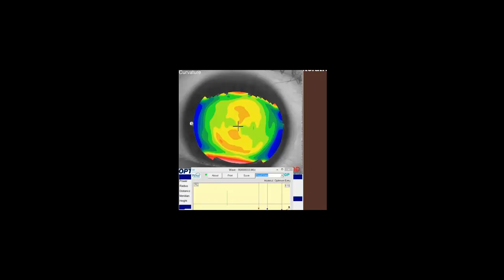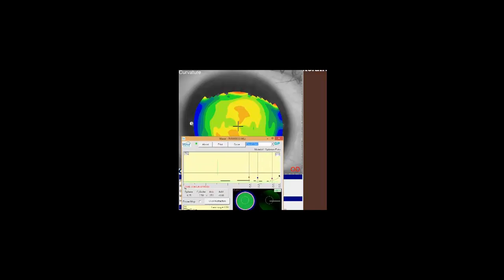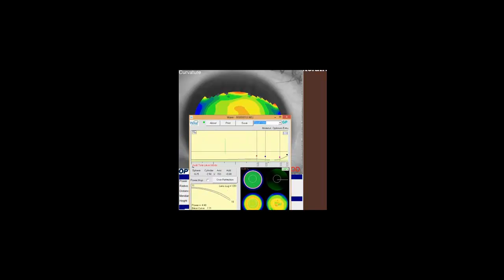I see from your clinical request you're looking for assistance in trying to get your lenses to fit a little bit better. Well, if you look at the designs, first thing to notice with this patient, you have a couple diopters of corneal cylinder. So as you know, your two principal meridians are right about here and this way. So I noticed that you went with the G-SIM design, and based on the patient's previous contact lens history, it looks like you tried to match that lens pretty closely. It looks like you did a pretty nice job of that.